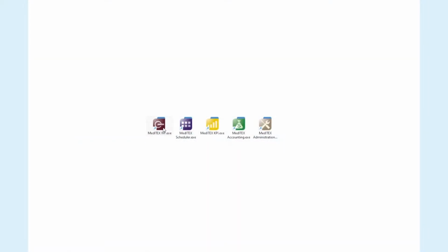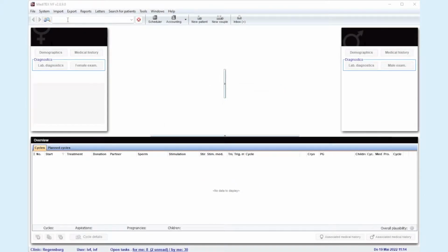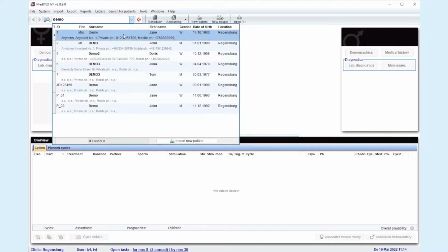Hello everyone, in this video we will show you how our fertility EMR MedITEX IVF works and how quickly it can improve your workflow. MedITEX IVF gives you all the essential tools to manage and view the journey of your patient.